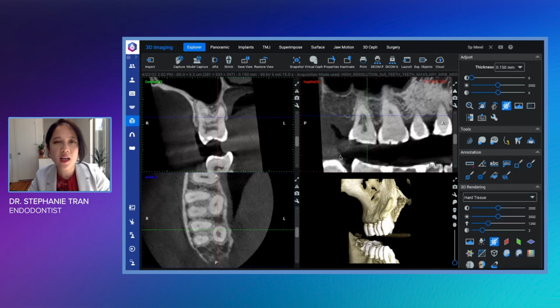Because of this finding that the resorption defect extended basically to the mid-root portion of the tooth, we're looking at a Heithersay class 3, and the treatment of this tooth is highly guarded with the prognosis. The way we treat external cervical resorption is that we have to remove the resorption, just like when we have to remove inflammation due to periodontal disease. You have to remove most of that inflammation. That inflammatory process, though, is so extensive that by the time we remove it, there's very, very little tooth structure left. And because there's so little tooth structure left and it's so deep down the tooth that's often unable to be accessed, treatment of this tooth was not recommended necessarily.